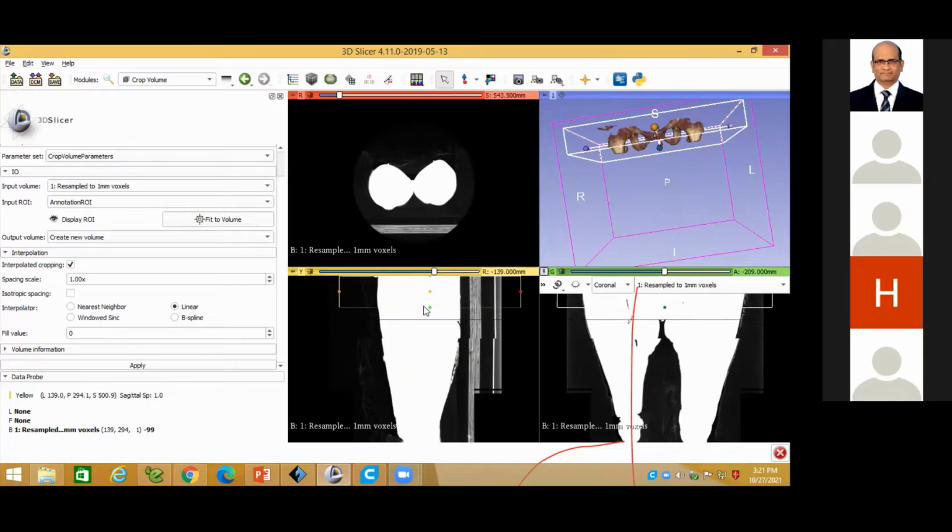Okay, up to this one is over. This is required. Okay, good. Now the adjustment along the length is over. I just want to adjust along the width here, then I'm choosing this one here.